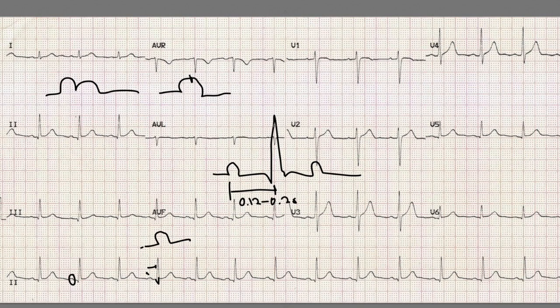And then we talk about the QRS complex. We first mention the morphology. As you can see, it goes down to form a Q wave. If it doesn't go down, a Q wave is not present. The upstroke is the R wave, and the downstroke is the S wave. And the QRS should be less than 0.12 seconds. If it's longer, we call that broad complex, and it can be significant for all sorts of different pathologies, which we will talk about later.